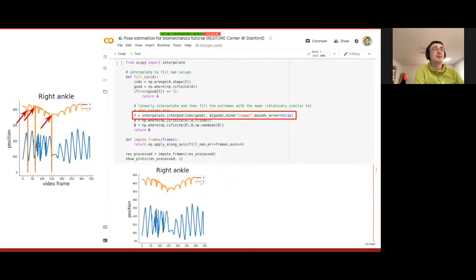First, to interpolate missing points, we basically will find where OpenPose gave 0, and we'll try to interpolate at those points by using linear interpolation. In the SciPy package that I mentioned earlier, we have the subpackage called interpolate that gives us an easy way to build a function that fills in those gaps. We apply it to this time series and we get rid of those gaps, as you can see in the output from this block of code.